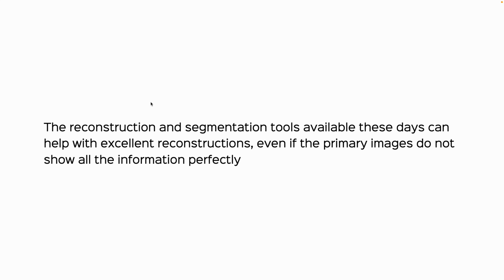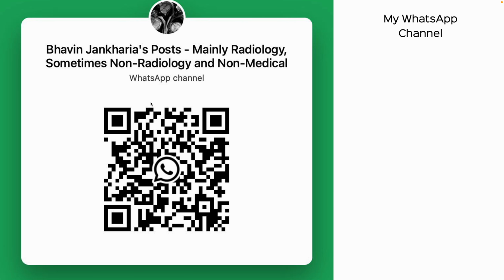And though the TotalSegmentator takes about 5-10 minutes once you click apply, and that's simply because I have 16 GB RAM, it is much faster if you have more powerful GPUs. The thing is, you can be doing other things while in the background it is doing the segmentation. So you're not just going to wait for that. And I think all of this is a game changer. And in the weeks to come, as I'm experimenting with this, when I come across cases where these work beautifully, I will show them. That's my WhatsApp channel.